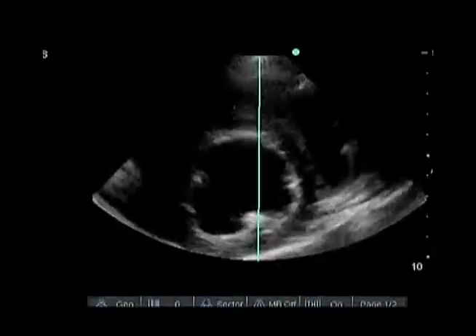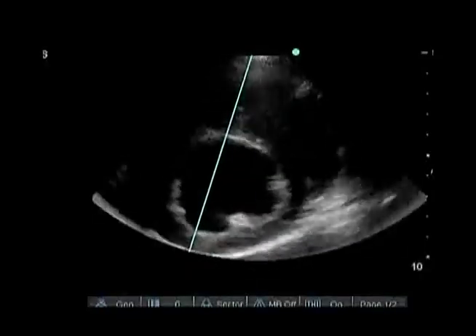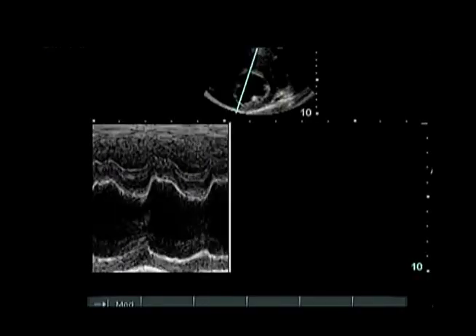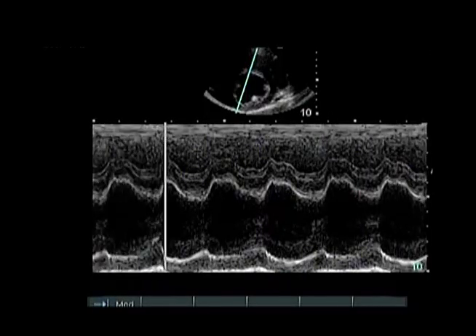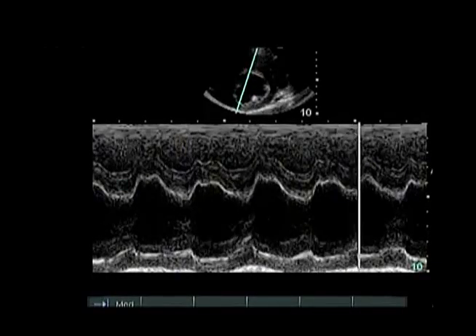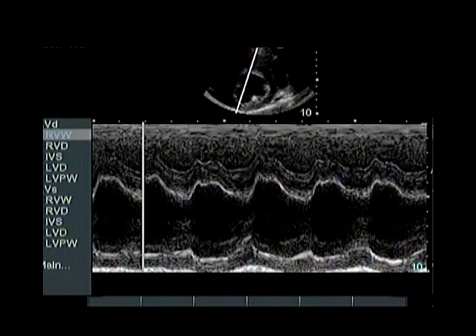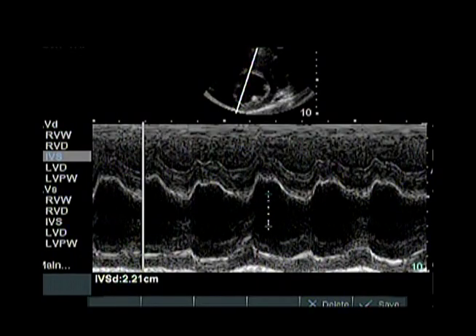Cardiac chamber enlargement indicates a volume overload most commonly seen with a valvular insufficiency. If a valvular insufficiency is significant, the chamber into which blood is leaking will enlarge. It is possible to have a valvular insufficiency that does not cause chamber enlargement and therefore is insignificant.